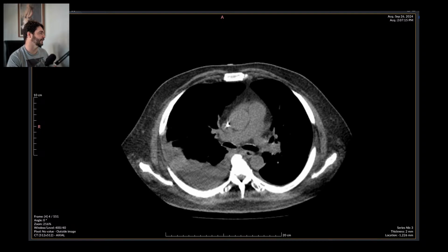This can't be good. This patient is quite old, and the ER is the ER right there. So let me just grab a template. I have a template for old patients from the ER that get abdominal CT scans.